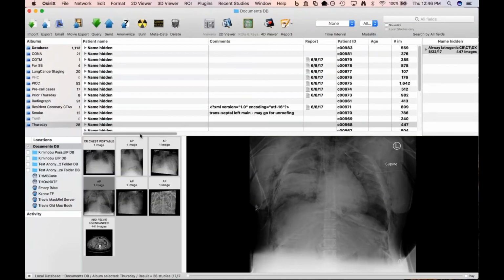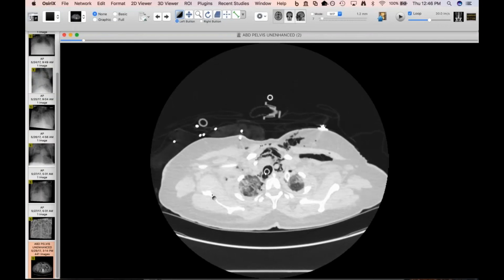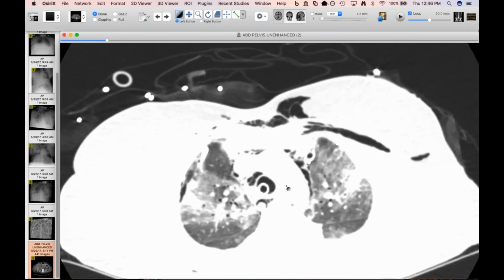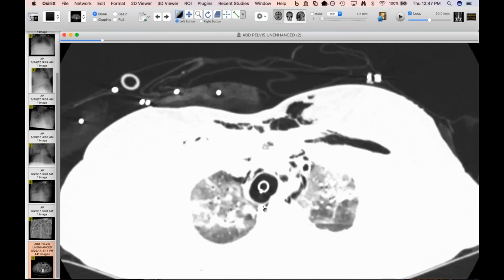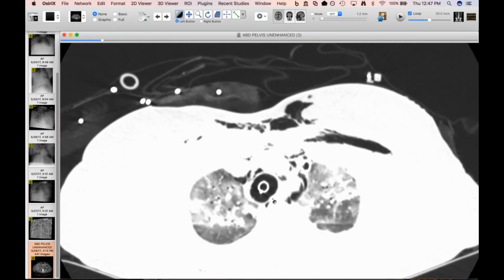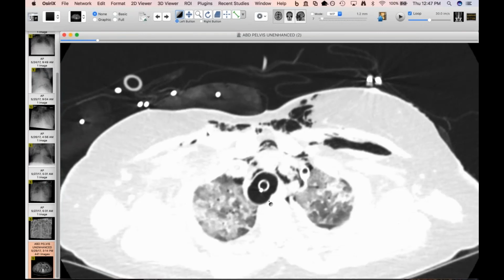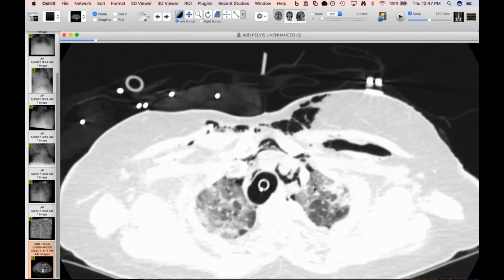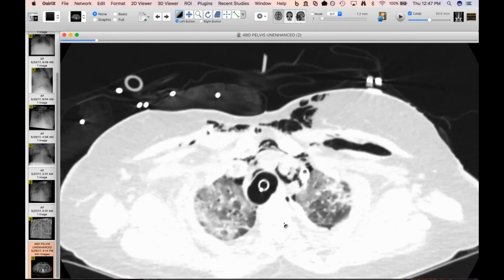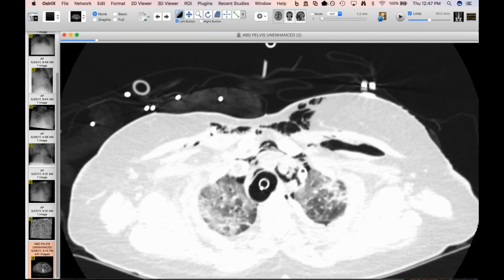Do you think on that CT the balloon was inflated there, right? Yeah. Okay. Yeah, if you window it, it looked like at least here maybe it's a little portion of the balloon membrane. I don't know, but it was definitely inflated here. Got it. It's not easy. I've seen small injuries from balloons, not a massive hole like this looks like. Yeah, and it was a 3.5 centimeter tear, and it makes sense that it would be posteriorly in the muscular or membranous portion of the trachea. Yeah, never seen that.